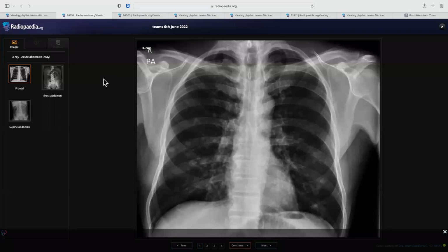So I'm provided with a frontal chest radiograph of a fused skeleton, probably a male patient. Most striking feature that I can appreciate is multiple small nodular densities scattered in both lungs, more pronounced on the right side. In addition, a few similar densities are seen within the retrocardiac region on the left. I cannot appreciate any pneumothorax or pleural effusion in this image. Aortic arch is on the left side. Now I'm looking at the bones. The bones look fine to me.